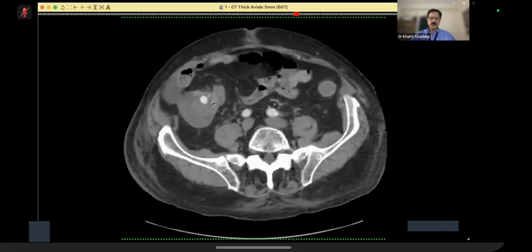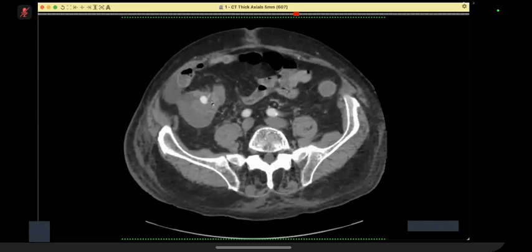Can it be a food residue here? Yes, it could be. I would also correlate with the venous, portovenous phase and delayed phases to look for increase in any size of the blush. If that's increasing in size, then it would be blush. If it's not, and if it is also present in the plain scan, it would be a food particle. Okay, thank you.